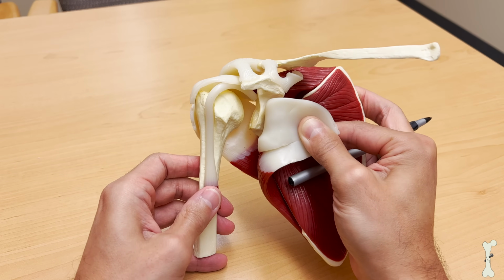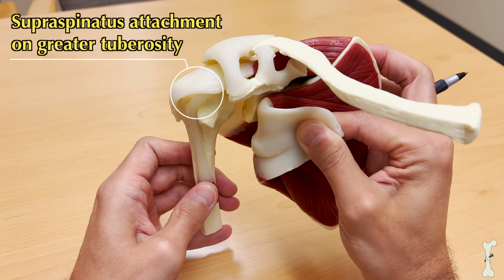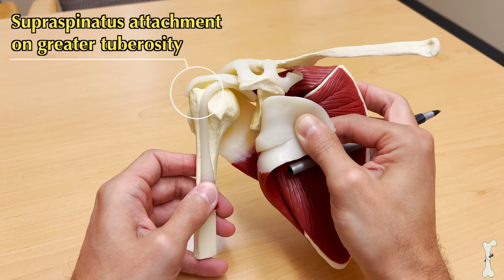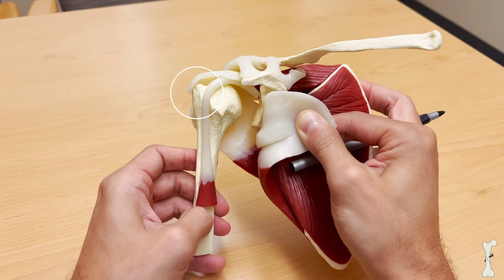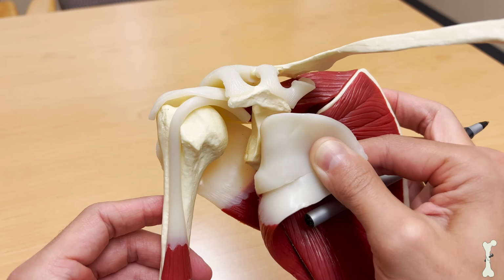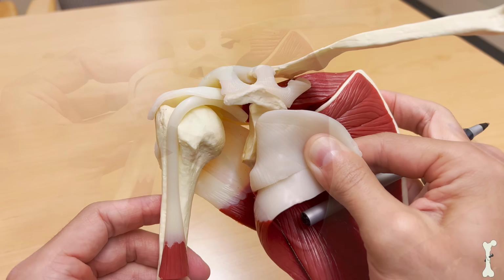where it attaches along the top of the shoulder blade, and as it runs from this area laterally towards the outer part of the shoulder and attaches onto the greater tuberosity. So I'll bring that a little bit closer so we can see that orientation right there. So that's the supraspinatus tendon as it runs and attaches to the greater tuberosity.